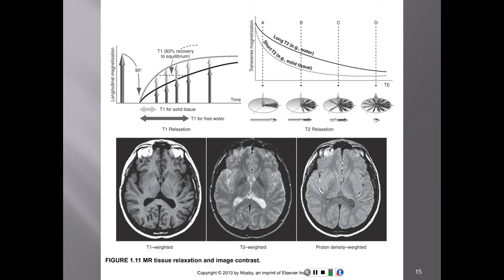So the grayscale in an MRI image can vary greatly because of inherent tissue properties and can appear different with each patient and across a series of images. So you must be familiar with that. This is a picture of the brain.